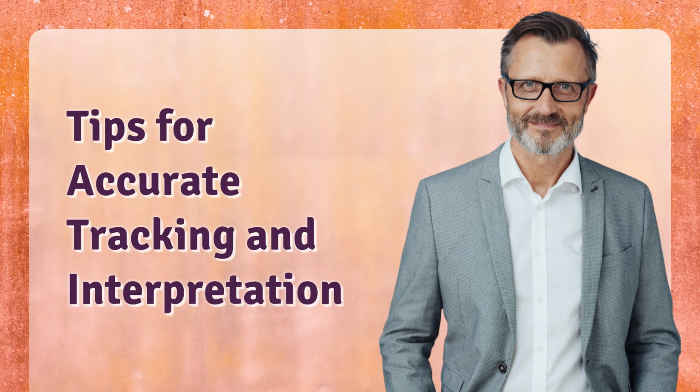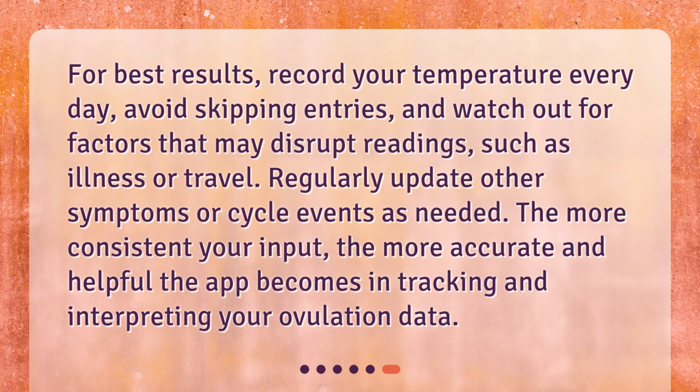Tips for accurate tracking and interpretation. For best results, record your temperature every day, avoid skipping entries, and watch out for factors that may disrupt readings, such as illness or travel. Regularly update other symptoms or cycle events as needed. The more consistent your input, the more accurate and helpful the app becomes in tracking and interpreting your ovulation data.